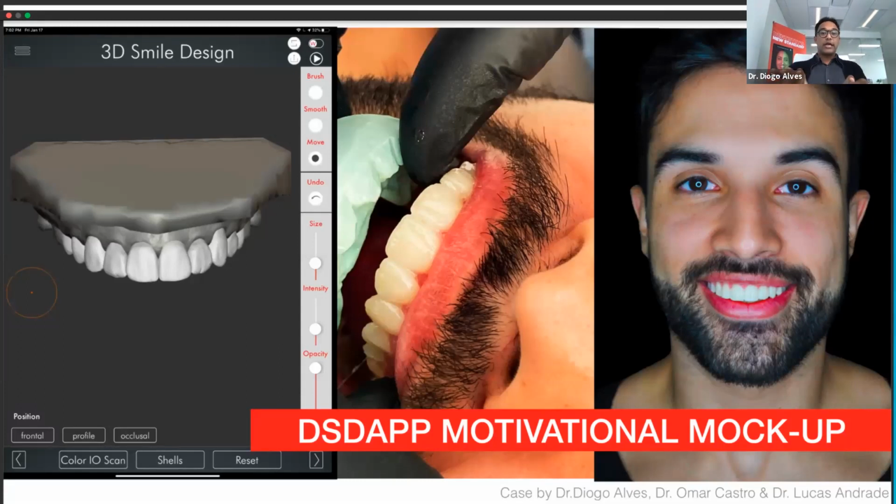As I was showing you guys before on the previous screen, you would be taking that ideal mock-up and bringing those 3D teeth a little bit outward, so you would be covering the patient's existing teeth. You would print, create an index and a bisacryl so you can do your motivational mock-up.